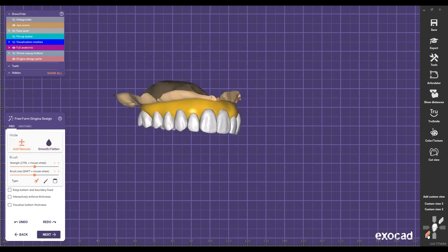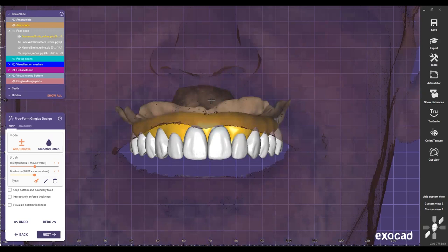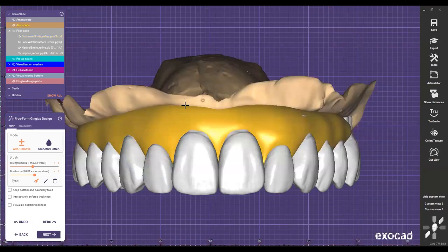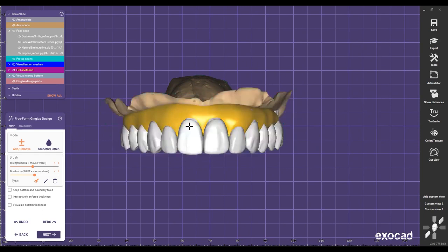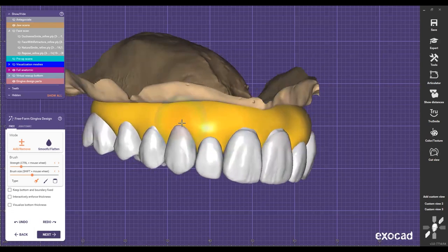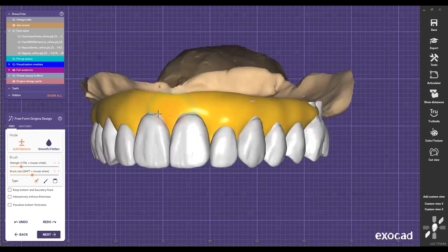So now, Fernando, what are you going to do with the free gingival margin? Here, remember, we said that we're going to go with the facial scan. That's why it's a 3D facially driven design, because we're using the face to get the design. We're not just doing this, right? Because if I do this, I'm hesitating. I'm guessing. So now I'm going to go ahead and start doing this. If I'm going to try to keep it there, and then later, once it's merged, I'm going to try to just pull it so I don't show this junction of the teeth here, right?